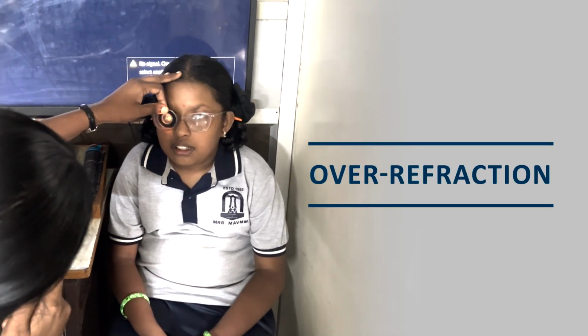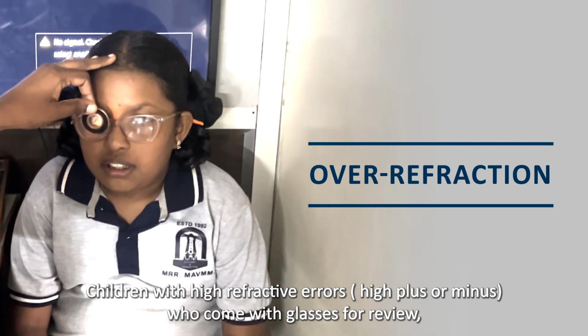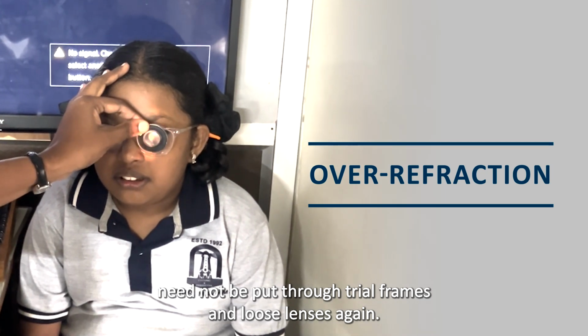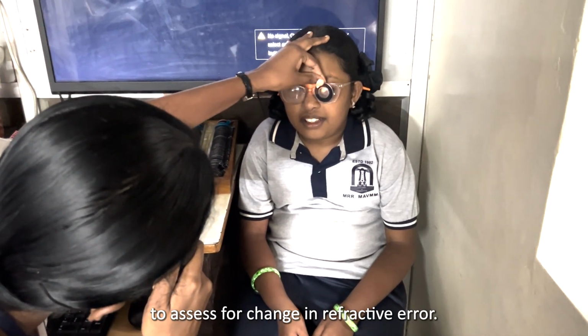Over refraction. Children with high refractive errors, high plus or minus, who come with glasses for review need not be put through trial frames and loose lenses again. Refraction can be done over their existing spectacles to assess for change in refractive error.